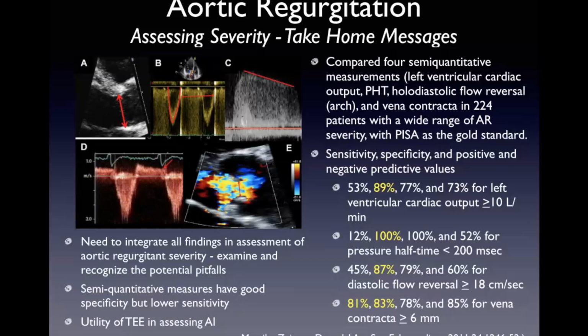I think part of it is that we trace more often with contrast than without, so we're more confident with contrast tracing. That's one thing. But I think contrast is a tool in our toolbox. It's an important tool, and we should use all the tools possible to get the best quality data.